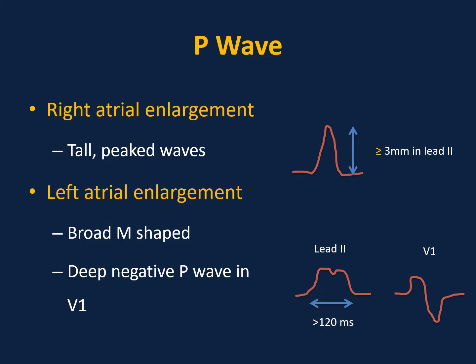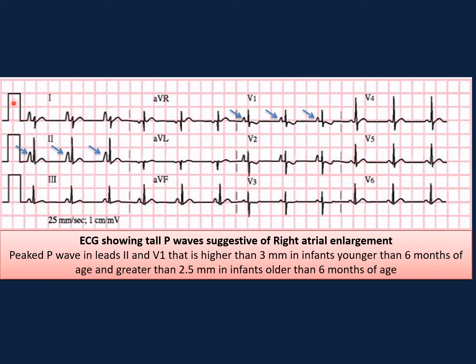So in this ECG, the calibration is standard: 2 large squares, 10 millimeters, as you see here, and the speed is 25 millimeters per second, which is standard speed. The rhythm is regular. There are 3 large squares between the R's, so 300 divided by 3, the heart rate here is approximately 100 beats per minute.